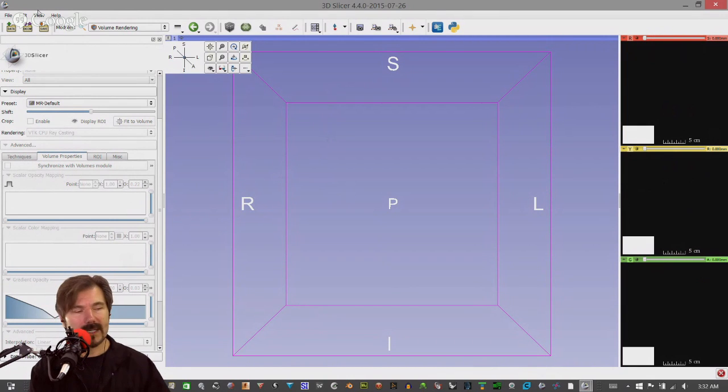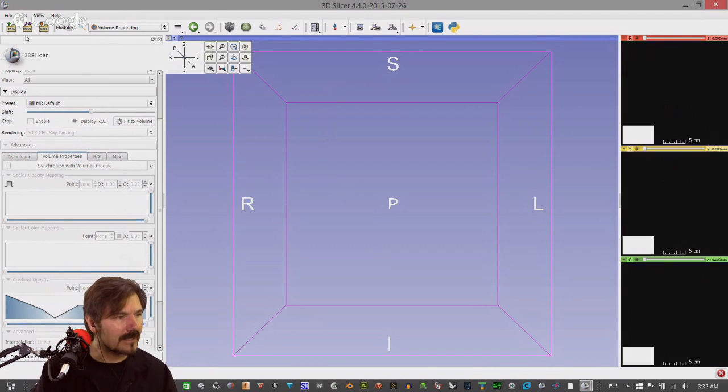Now, why did I want to do that? Because if you leave remnants of previous scans and modifications, they show up, and then if you don't turn things on and off properly, you're wondering, why am I still seeing this? At least that's what happened to me early on, being a novice. So I learned to literally clear the slate.